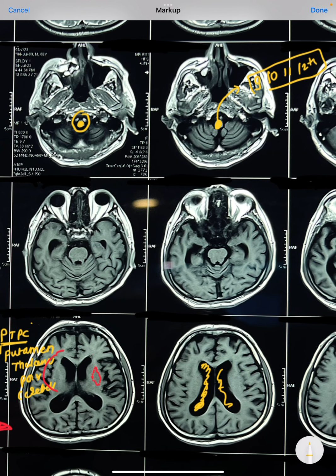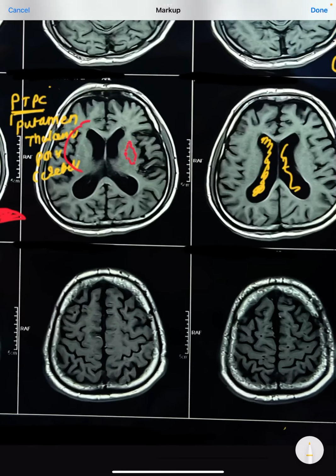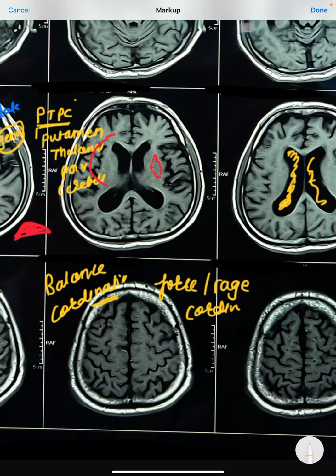Just behind the medulla, these transverse folia are very typical of the cerebellum. We call it the folia, or arbor vitae arrangement. This is very, very typical of the cerebellum. This is all cerebellar structure. The cerebellum is very, very important for balance, coordination, and any muscular movement, the force, the range, and the coordination. This all is decided by the cerebellum.